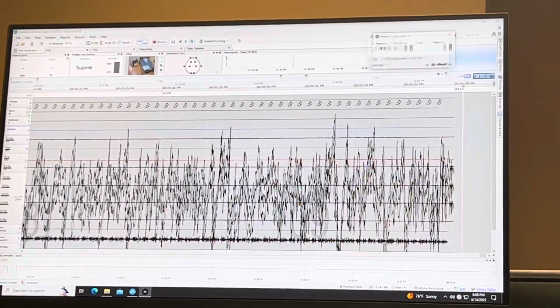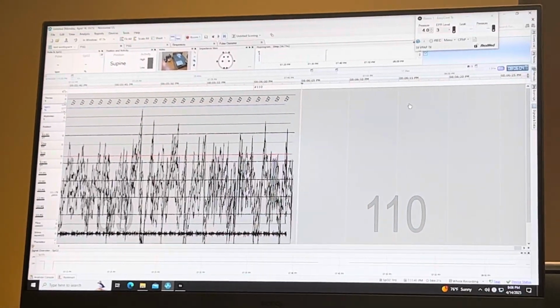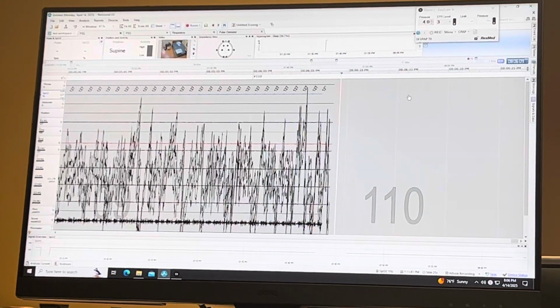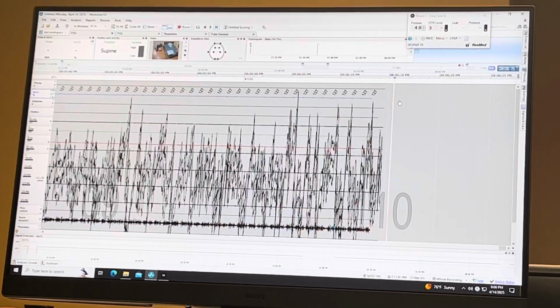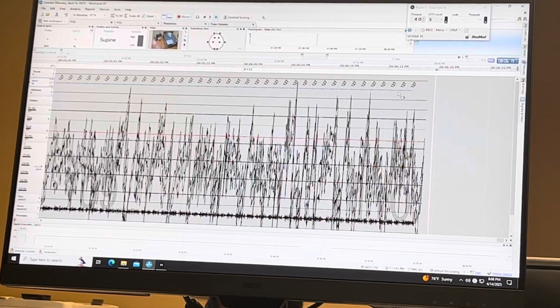And then your ResMed window should stay kind of floating on top of everything. So this part takes a little bit longer, that's why he says to do it when we're ready to go in. It can take its time and formulate and do its stuff instead of you being ready for it. So don't wait till 1:55.